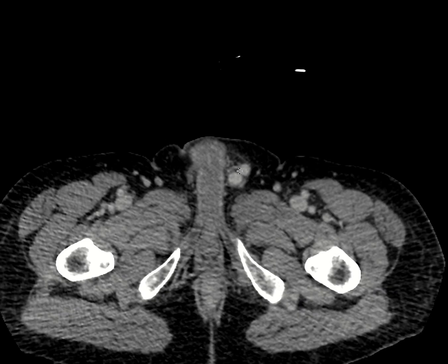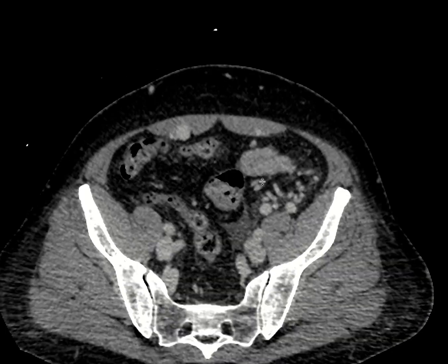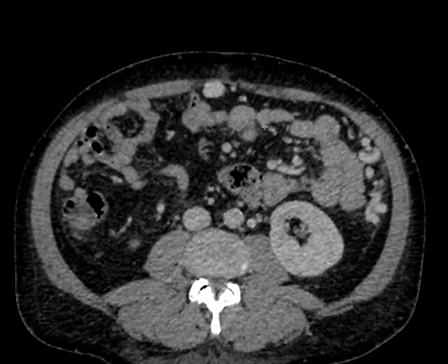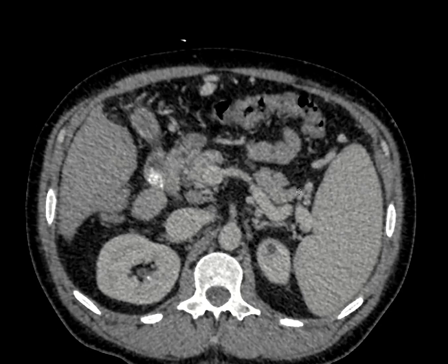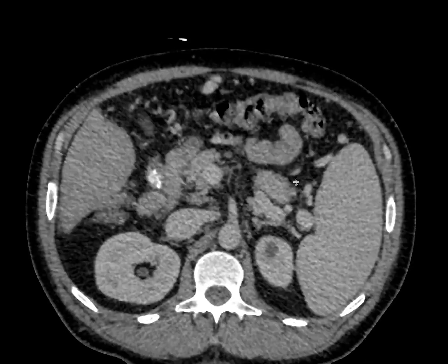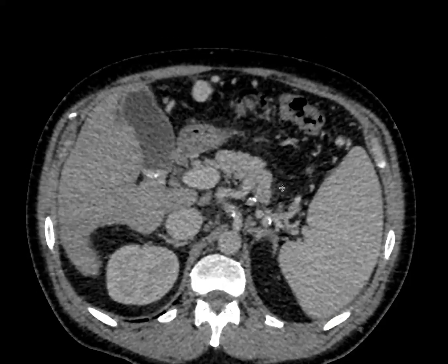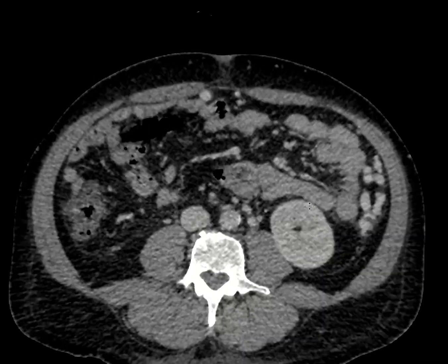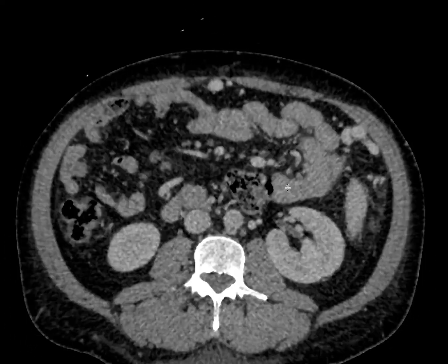varices here. And so again, this is trying to figure out different pathways to be able to drain back into your systemic circulation. Usually splenic veins, the dilated splenic veins, will drain into your left renal vein. You'll see a nice connection between the splenic varices and the renal vein, but in this case you're having a splenogonadal shunt back to the systemic circulation.